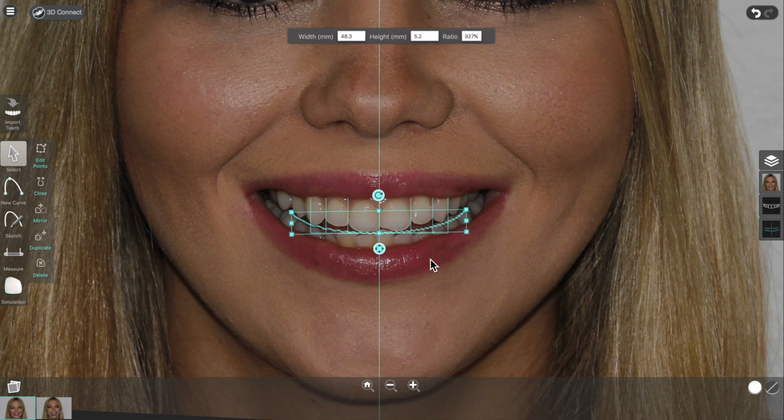So you see, when I select something in this editor, a box pops up with the editing controls. So we've already seen the movement handle, and these little squares allow you to scale and stretch the selected object or objects. If you drag a corner handle, it scales the object while maintaining the proportion. And if you drag an edge handle in the middle of an edge, it stretches and distorts that object in the direction that you're pulling it. And at the top there is the rotation handle, which we've already used.